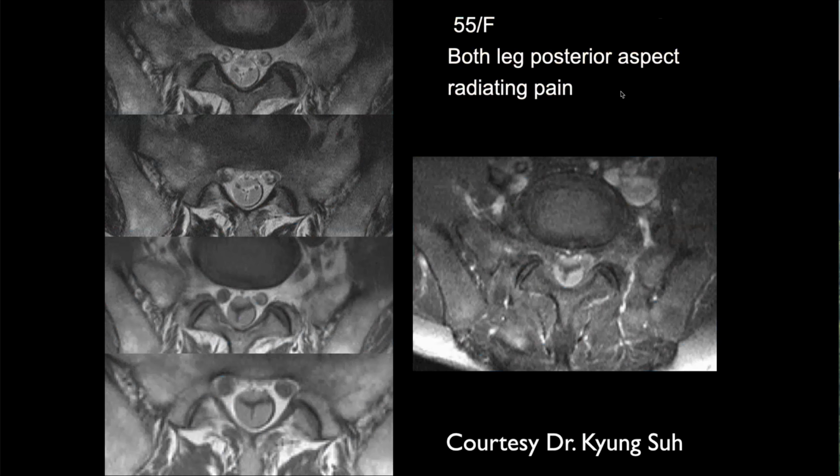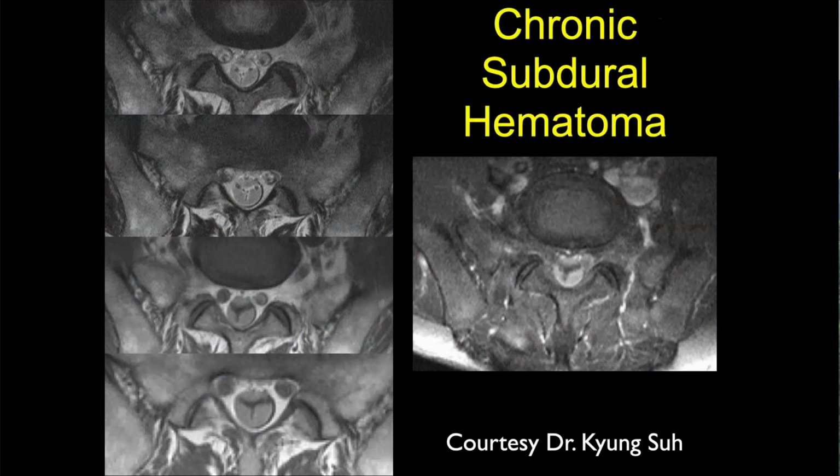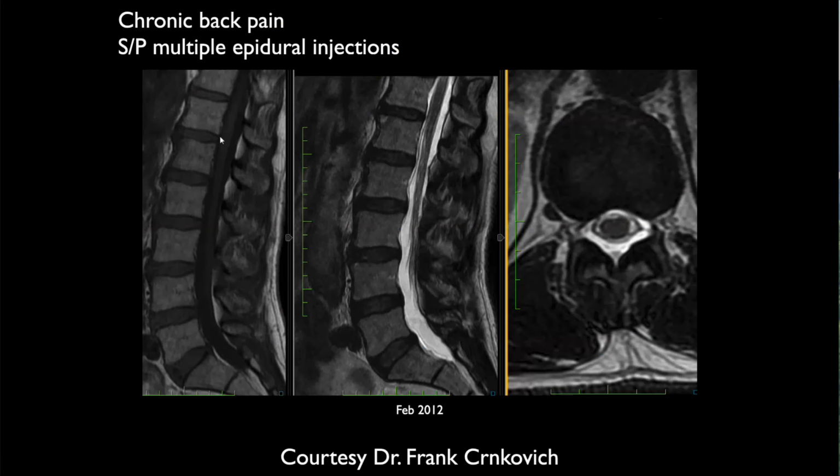Both legs, posterior aspect radiating pain. Well, it's like the spinal cord has that Mercedes-Benz type of look to it that we just talked about. So another subdural. This was a chronic subdural. Good.